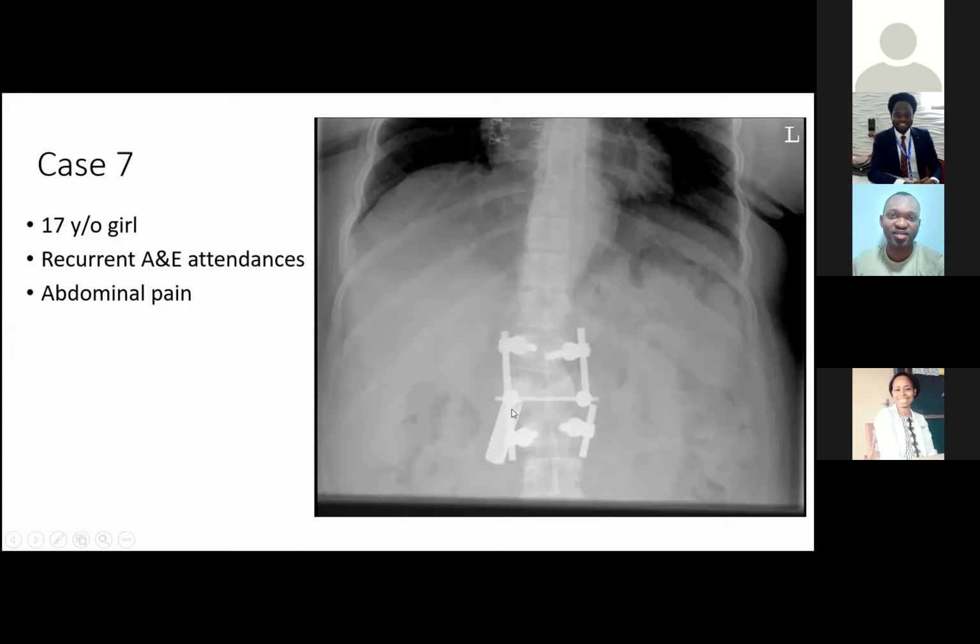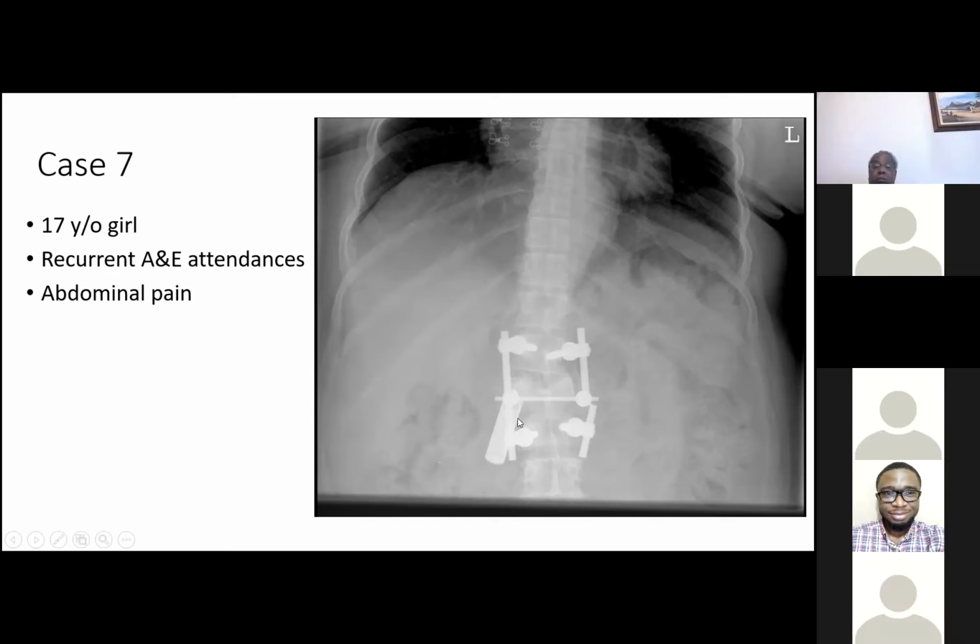This is a patient with a long history of ingesting foreign body material. On this occasion, she had swallowed a couple of batteries, and this was one of them. So this would constitute an appropriate indication for x-rays. When you suspect a history of ingestion of either blunt or sharp foreign bodies, x-ray is very good, especially if it's metallic density. Obviously, if it's not of metal density, the x-rays can struggle.